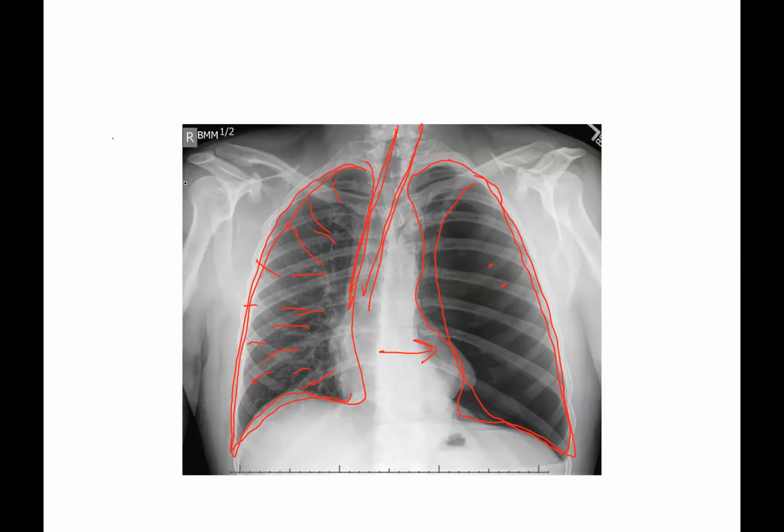Aisha Muhammad. Maybe tension pneumothorax. Why do you say tension pneumothorax? Because there's a mediastinal shift.